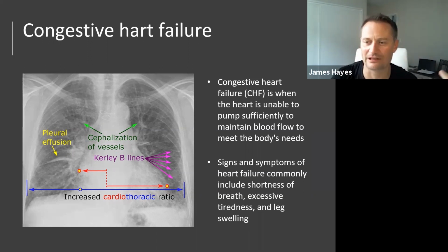It's when the heart is not able to pump sufficient blood to meet the body's needs, so it starts to get very big. Now, there's a whole lot of other stuff going on in here.